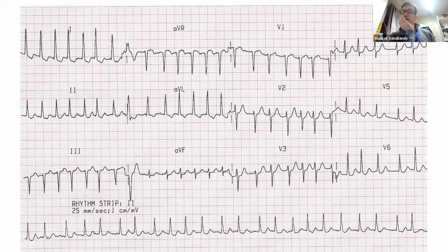Okay, have a look at this example, please. So ask yourselves the questions. This is a tachycardia, yes. Is the QRS narrow? Yes. So the QRS is narrow. This means that conduction from the AV node down to the ventricles is normal. Is the rhythm regular or irregular? The spacing between every QRS on the rhythm strip is different. The spacing is variable. It's irregular. So this is an irregular rhythm. Are there any P waves? You cannot see any definite P waves.